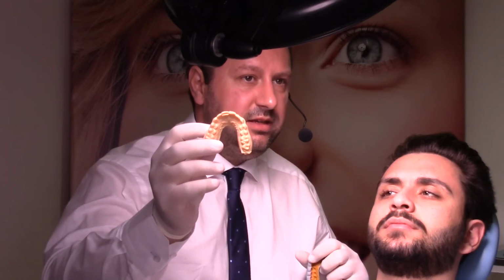A question, please? Yes. Dr. Iliev, I would like to ask you, once you send us through the STL file the new aesthetic proposal, can we do any corrections, adjustments to the final design that you proposed, or that's it? So at the moment, you have 2 free corrections.